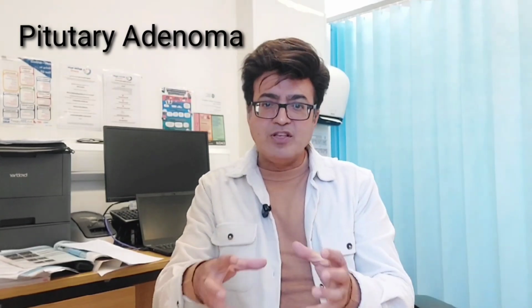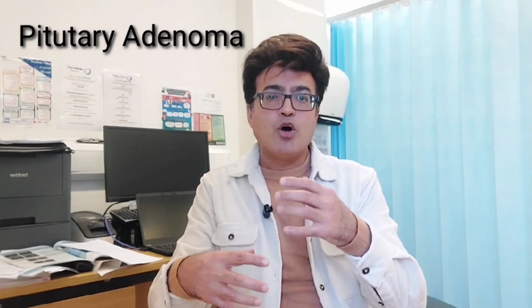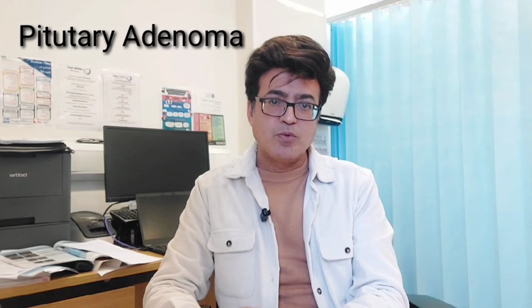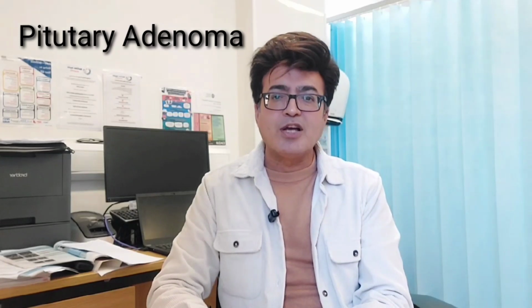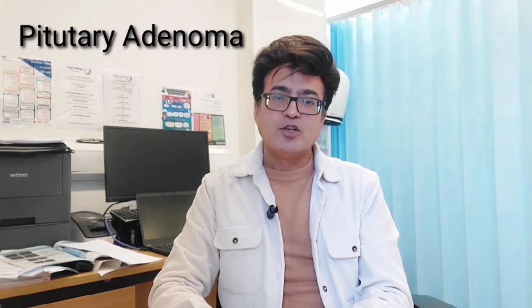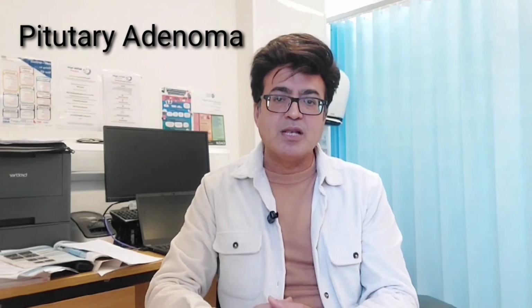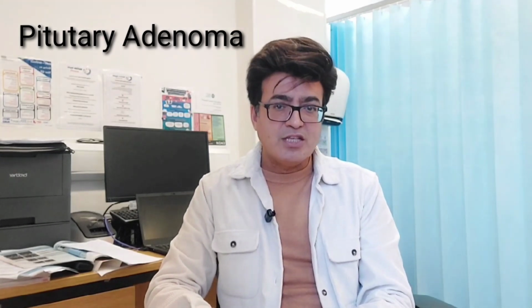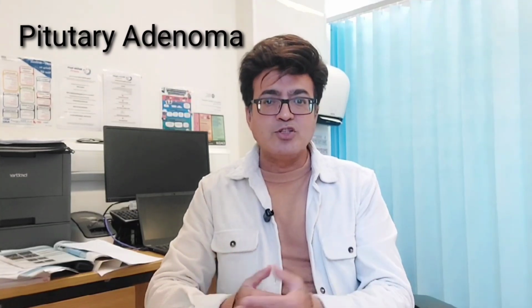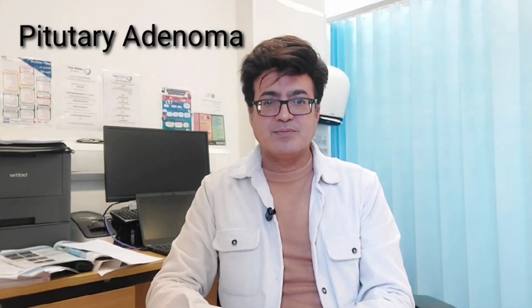So these two features, how we will see them on the images, on the CT images, on the MR images. And another point worth noting is that microadenoma is quite often treated medically, and macroadenoma requires surgery. So these are all the points. I will further narrate on that while I show you the CT images and MR images. So let's start watching these images and find out how the microadenoma will look and how the macroadenoma will appear on the radiology images.